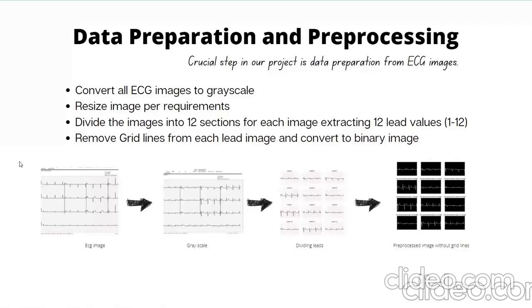But the thing is, inside the ECG image, there is a lot of text involved, like AVR, V1, which are hard coded. So we have to extract only the signal out of it and remove all the text. So we were doing a lot of contouring and other stuff. Let me showcase a Colab for a basic understanding of all the steps. Let me go to the Colab.